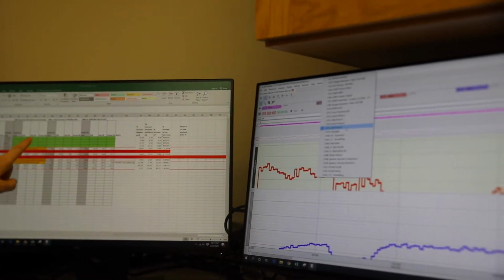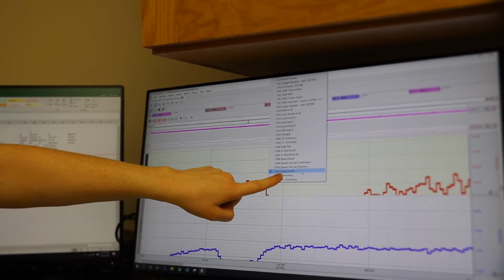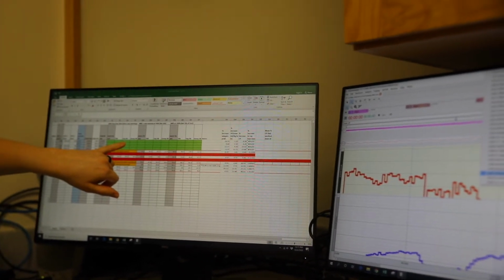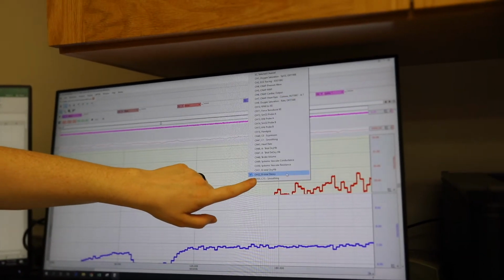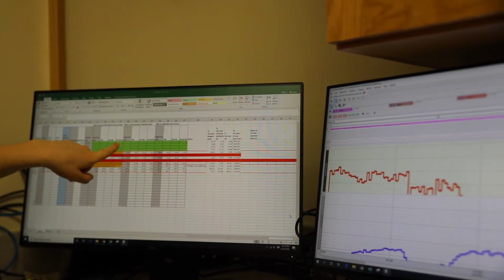The second one should be the total hemoglobin for probe B, which matches up with the Excel sheet again, the THB. The third set, this 51, the B is for probe B again, and then the total oxygenated hemoglobin, which again should match up over here. And the last one is again the probe B for the total deoxygenation, which again should match up with the Excel sheet.